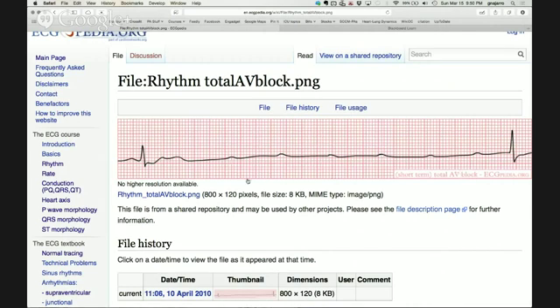Why is this third degree AV block? Well, what you're seeing is 2 ventricular responses. What we see is a lot of P waves. 1, 2, 3, 4, 5, 6, right? And when the P waves come, the QRS has a variable response, right? The PR segment here, the time between the atria depolarizing and the ventricles depolarizing, is completely variable. Another way to look at this is to try and draw. See if I can do this. One second.